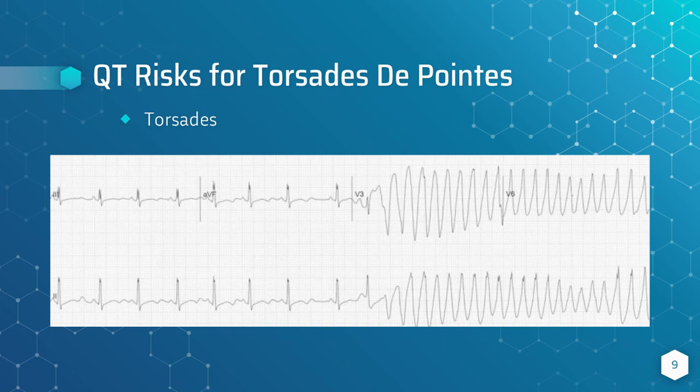And here's just another example. With this patient, they did have a prolonged QT. So again, if you shock this patient out of it and got them back into their underlying rhythm and you gave them amiodarone, you're just going to prolong that QT even more and put the patient back into it. So depending on what type it is, if it's the actual torsades compared to polymorphic VTAC, your treatment plans do differ. That's why it's important to know what the QT type is. And it's important for pharmacists because the prolonged QT is usually going to be medication related.